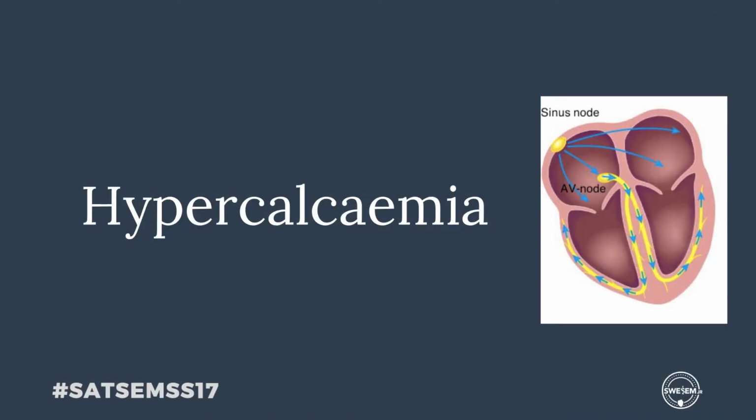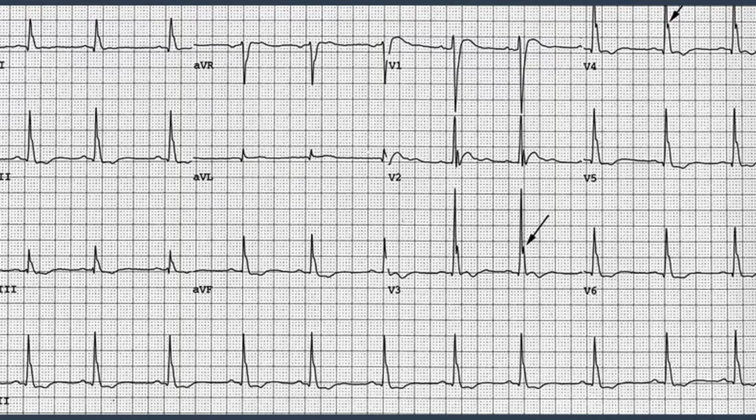Hypercalcemia works in the opposite direction, also logically enough, and reduces QT time by a shortening of the ST segment. In severe hypercalcemia, we can see something that is called an Osborn wave or a J wave, which is noted on this ECG, and I think it is best described as a dent in the R wave. With extreme hypercalcemia comes a risk of ventricular irritability, and VF arrests have been noted, although, as with hypocalcemia, it is less common than with potassium disturbances.